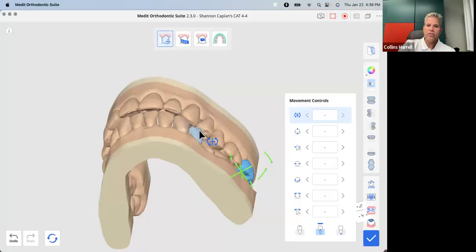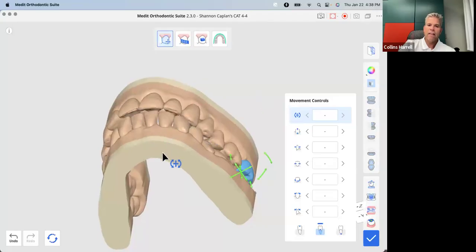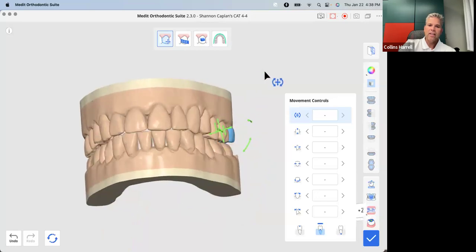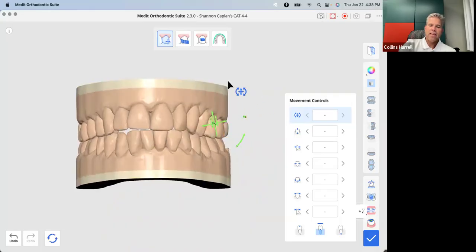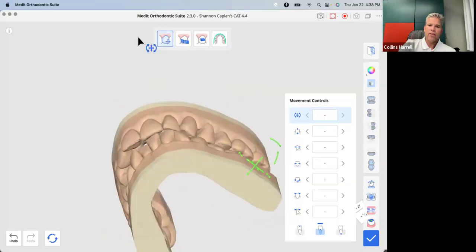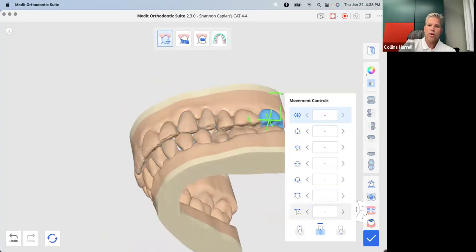Click back there. Watch this tooth. That tooth starts out very tipped to the lingual. So it does need that much of an inclination change, because I want this patient to have a nice broad smile. It is tipped lingually to begin with, and there's not enough overjet there. So I actually do want that 20 degrees of inclination change.